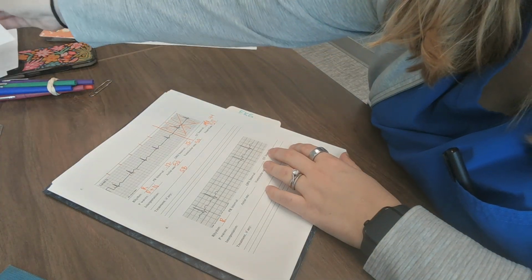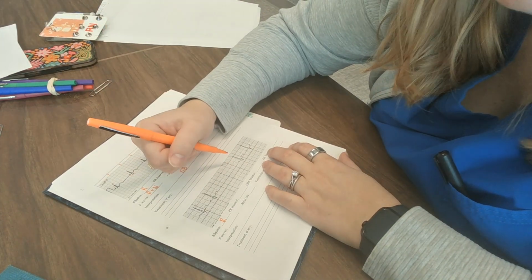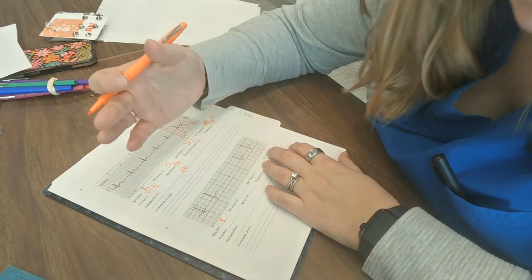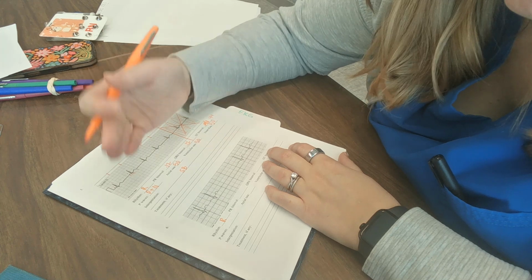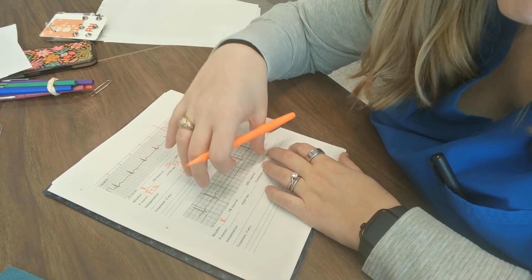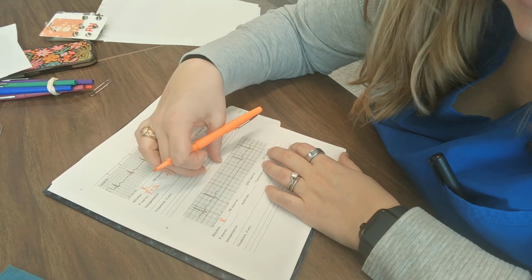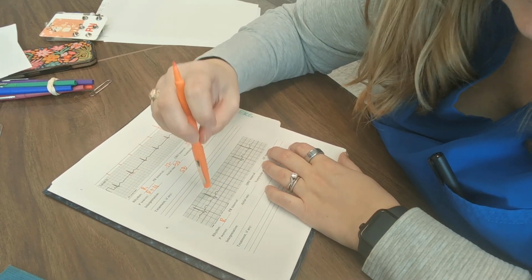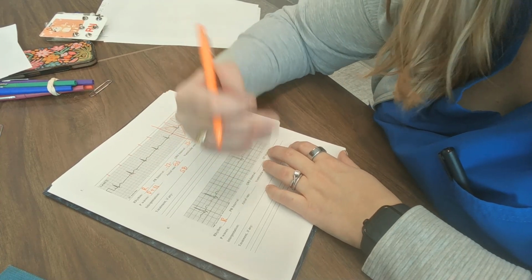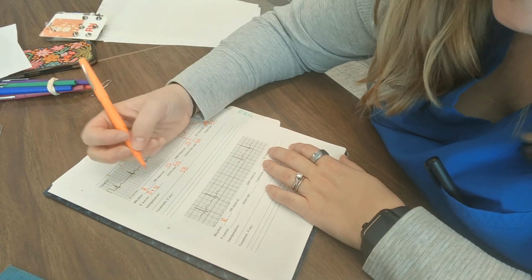And a little bit more information is like a sinus pause is going to be less than 3 seconds, and the R to R is going to be equal, and it's like a multiple of that. So it's going to be 2 R to R or 3 R to R, something like that. Versus a sinus arrest is longer than 3 seconds. And we don't have a R to R that is going to be equal to a full number. So it's not going to be a multiple. It's not going to be 2 R to R or 3 R to R. It might be like 1.5 R to R. Basically, it just starts back up kind of randomly.